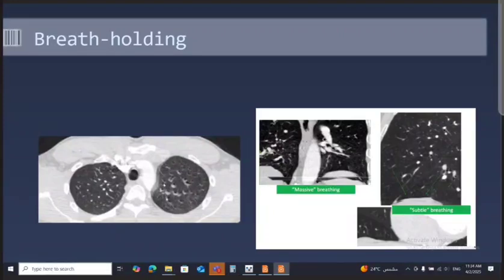The respiratory motion artifacts in the lung appear like this. We have here the white structures, which are the vessels containing the contrast, and the black ones are the air within the lung. In this image, we can see that there is no well-defined outline of the vessels, and so the respiratory motions here can degrade the image of coronary arteries.